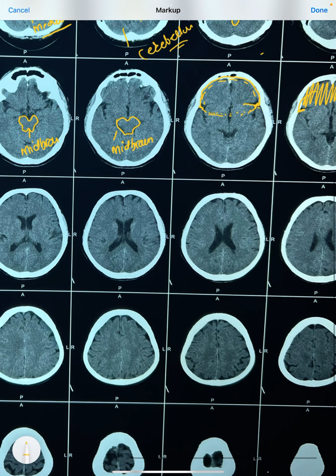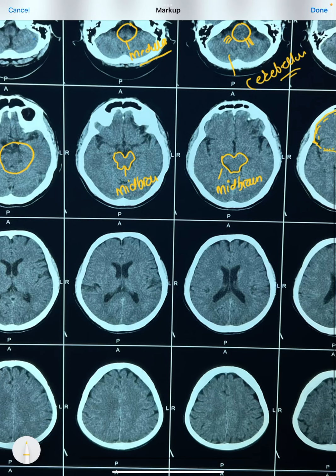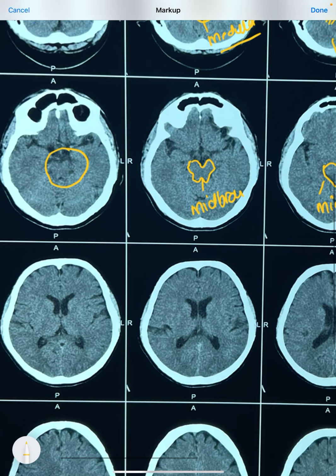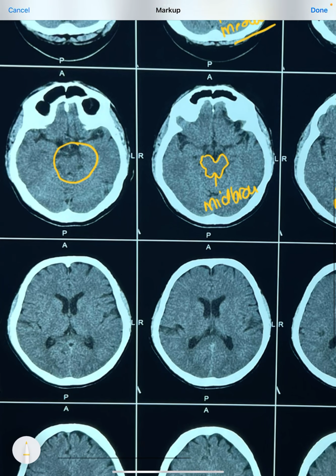The same way, it is very easy to identify the occipital cortex. Find out the brainstem structure, and behind that you'll get all occipital cortex. So this is all occipital cortex.